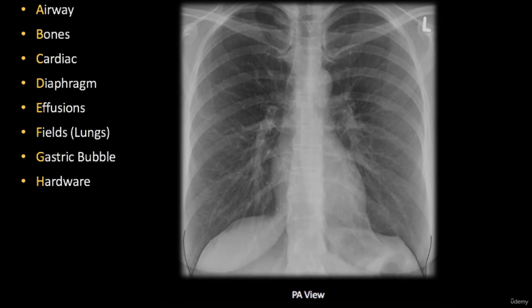Lateral to the dome of the diaphragm, between the diaphragm and the inner surface of the thoracic wall, you can see some angles, two recesses, the costodiaphragmatic recesses. Normally they are kind of empty. We have a very thin film of pleural fluid here, and the lower parts of the lungs slide down here in deep inspiration. So normally we have nothing in them.